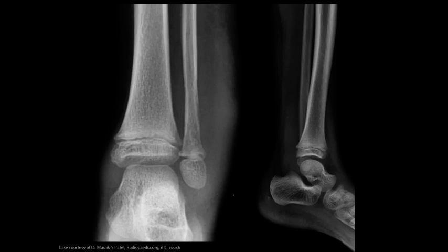All right, next individual. In the lateral aspect of the calf slash ankle, we can see there is a lot of swelling here. I mean, think about your own lateral, excuse me, not fibular head, that's proximal, lateral malleolus. There's not very much tissue between the lateral malleolus and the skin surface. This patient has about 2 centimeters worth. So that is a lot of swelling, and we can see that tracks up the side of the leg. Again, we're having that poor demarcation between the fascial planes of the subcutaneous tissue here and then the muscular tissue. So there's a lot of swelling in this region.